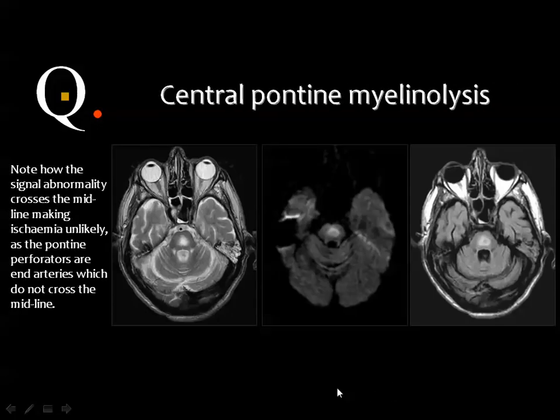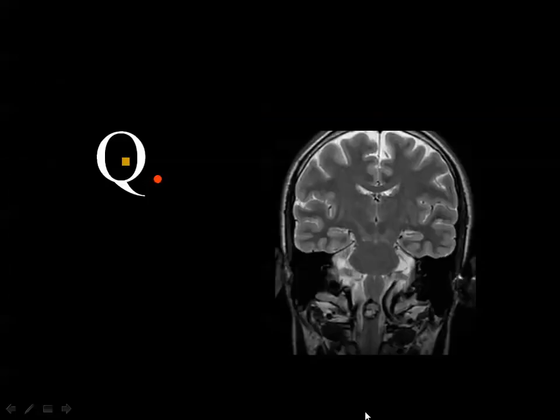I have said just a moment ago that central pontine myelinolysis does not show diffusion restriction, with few exceptions. Then this is one of the exceptions, where central pontine myelinolysis can show diffusion restriction.